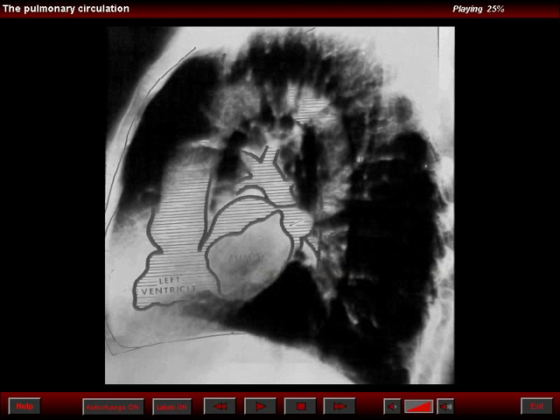If the filling defect was in the left auricular appendage or close to the wall of the left atrium, particularly if the left atrium is calcified, we would then suspect a thrombus or thrombi in the left atrium. When the filling defect is away from the left auricular appendage, there is no history of cardiac arrhythmia. There are no auscultatory findings suggestive of mitral stenosis. We then have to suspect that the radiographic abnormalities of the chest roentgenograms are due to a myxoma of the left atrium.